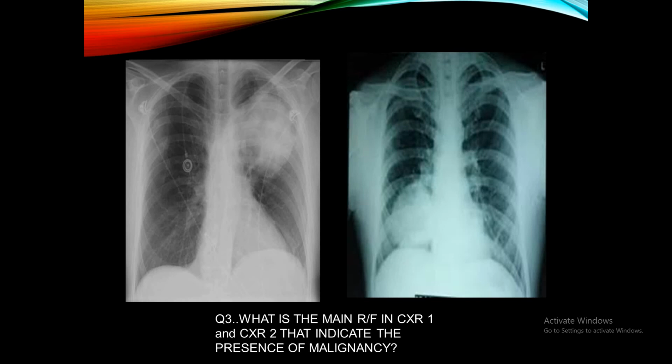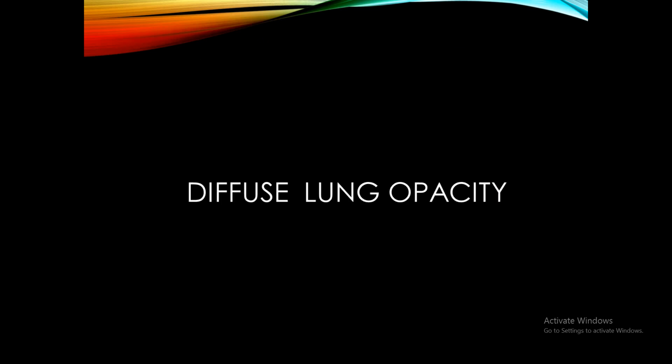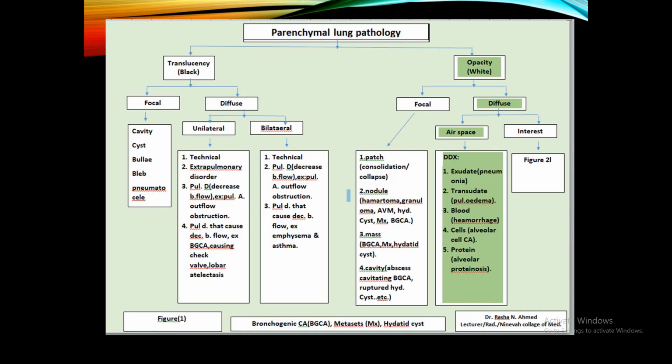X-ray, and I think we explained it in the slide. Very clear. Diffuse lung opacity. After we finish talking about focal lung pathology, we are now talking about diffuse lung opacity.